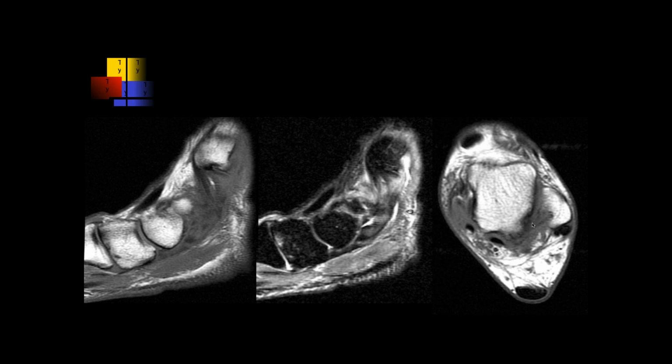So there's quite a bit of increased signal of the posterior tibialis tendon. It looks very thickened and increased signal throughout there. And I don't know, but it looks like this is an acquired pes planus deformity. I know I can't see the talus, but it kind of looks like that. Some degenerative disease. And you said early degenerative disease there as well.